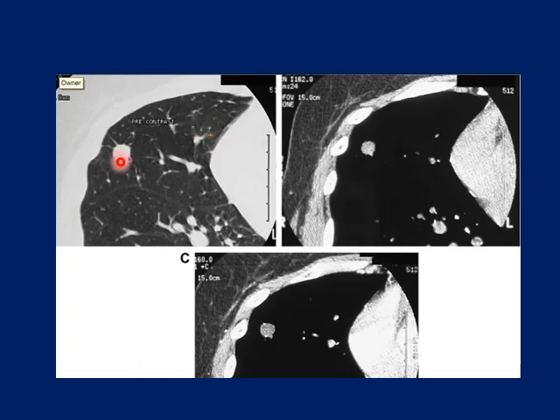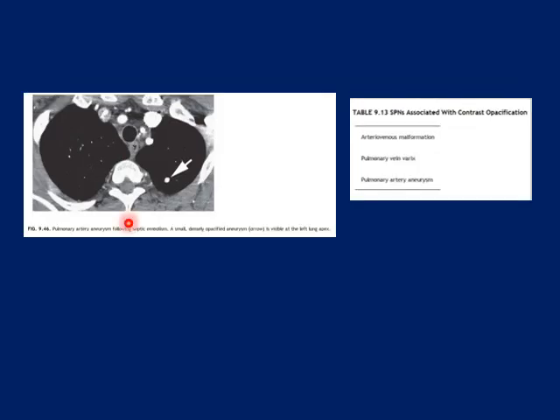Okay. This is an example of a lesion, pre-contrast and post-contrast. As you see, this is pre-contrast, and I think this is post-contrast. There is enhancement here. The lesion shows enhancement, denoting that it is malignant. As you see, there is a pleural tail.